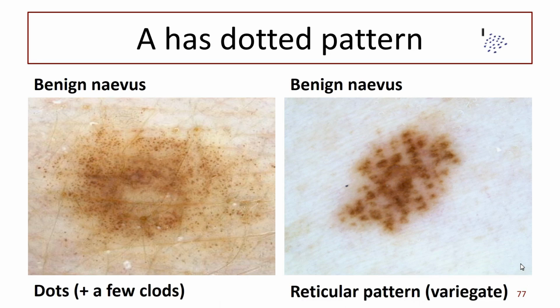So obviously the dots are on the left, and they're both benign. They're just different types of nevi. This one has a paler centre, but it's not a white centre. It's hypopigmented, if you like, but it's actually the colour of the background. So the pigment is in the periphery, and there are even dots around that. This is actually a congenital nevus and stable, as opposed to the dots around the nevus that Professor Sawyer showed us that represent an enlarging Clark nevus.